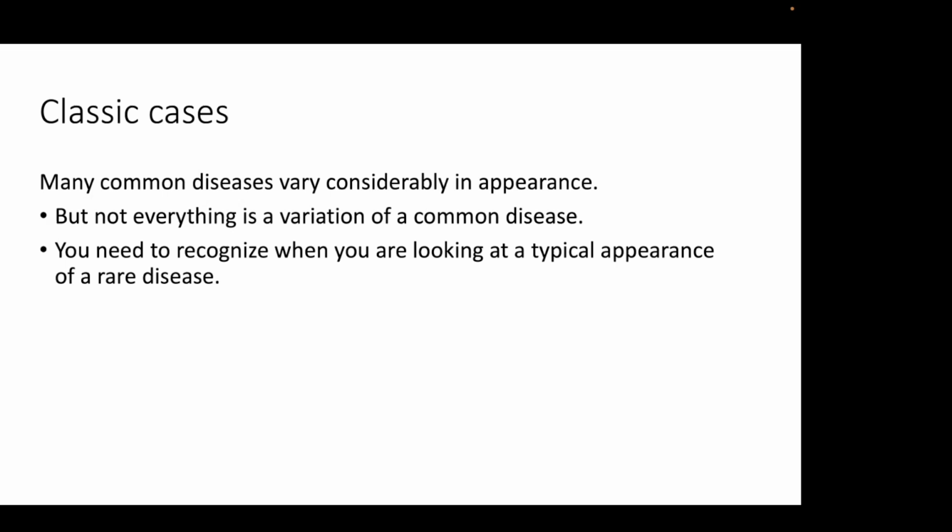Okay, we're going to look at some cases, and I'm sure you're all aware, but the one way I think about dealing with clinical cases is that I know at the beginning, as simple as it sounds, that common things are common, and that some diseases like meningiomas, as you know, can vary. They can be intraventricular, they can be intraparenchymal, they usually are extraaxial, they can have restricted diffusion or not, they can calcify or not. So there's so many variations of meningiomas.